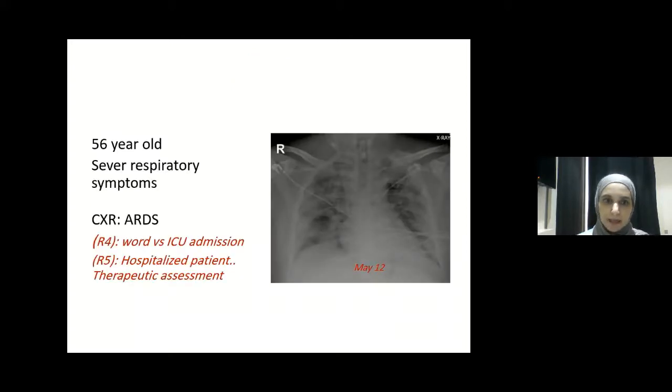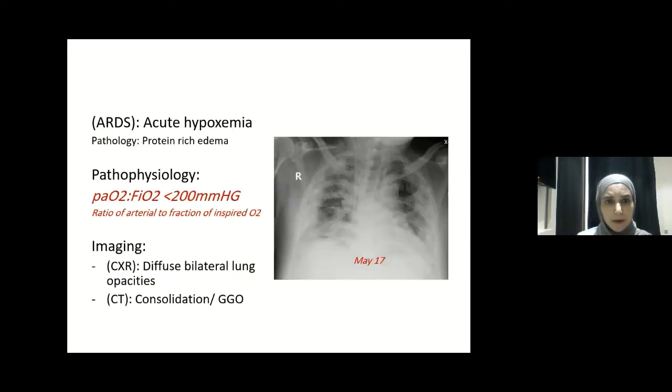Another severe case, an ICU patient with ARDS, nearly complete white-out lung with severe respiratory symptoms, warranting further imaging and further follow-up with chest X-ray to assess the therapeutic response. A brief about ARDS: it's an acute hypoxemic state. The pathology is related to infiltration of protein-rich edema, which sometimes may progress into fibrosis.